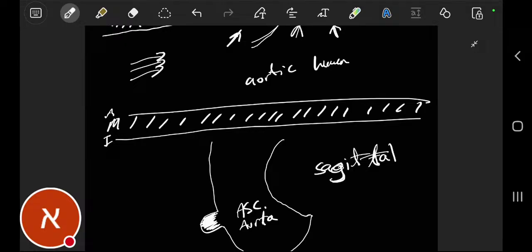So to differentiate between the two, think a little bit about the patient and what prior imaging the patient has, and what we are looking at. Are we looking at intramural hematoma, or at an outpouching from the aortic lumen without IMH, without intramural hematoma?